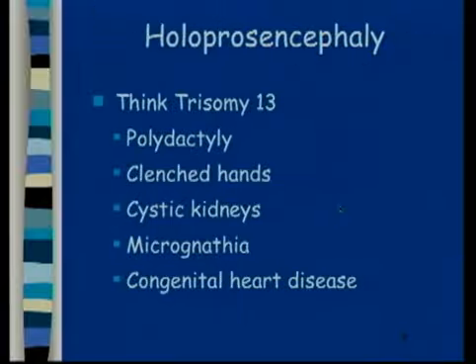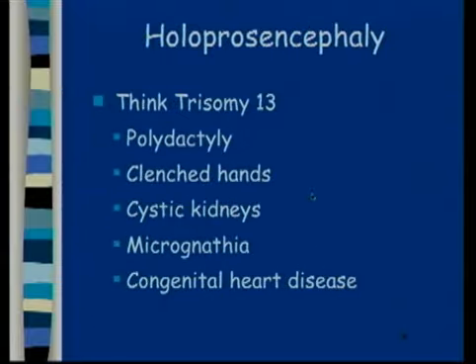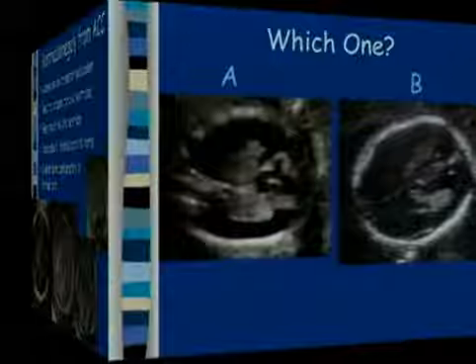So let me go back and just show you the teardrops here on the original picture, that teardrop parallel picture of the ventricles. That's usually the one thing that we can pick up.